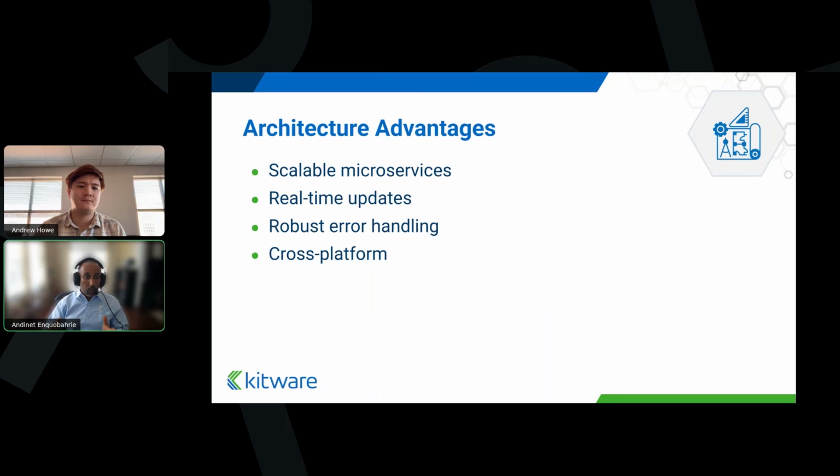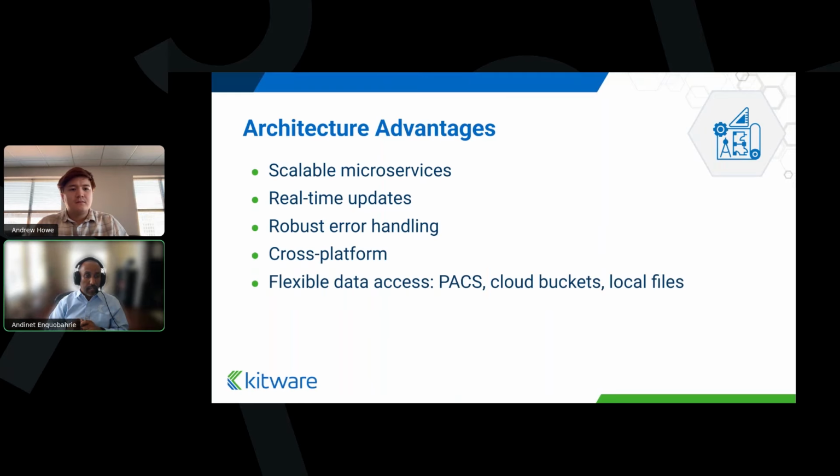It's cross-platform, obviously, because it's a browser-based application. So whether you are on your Mac, your Unix, or Windows, whether you're in Firefox, Chrome, or Safari, you'll be able to use it, right? And then, as I mentioned earlier, there are multiple ways of bringing data into the system, into your application, either connecting with a PACS system, or from a cloud storage, or from your local file.